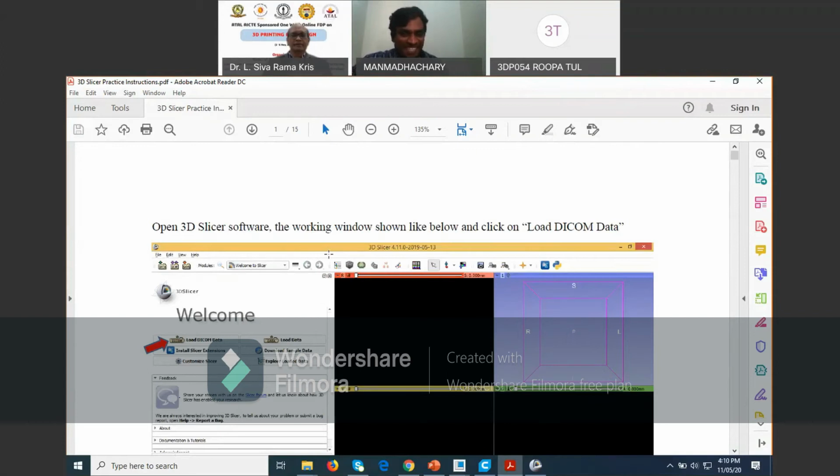Yes, sir. Shubham Bera also completed. Here in this only we can extract the diagram to STL or OBJ file only. Someone said, got it, sir. Based on practice, I believe we can improve the threshold and cropping also. Yes, you can do it. Practice will make a man perfect. Yes, Rubita Ghosh also completed. Completed, sir. Thank you.